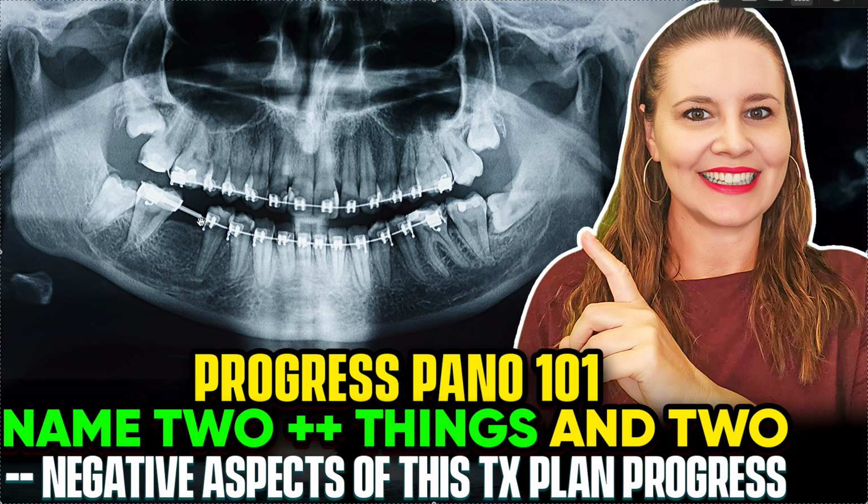I do like that they put in a piece of tubing or closed coil spring here. That shows me that they know what they're doing. Other thing I noticed that I like, that just shows me this was a competent doctor, these are just little things I look for in panos, is the fact that they cinched the wires in the back. That's the sign of a good doctor who's cinching wires. That means they're thinking ahead, they're thinking next steps. They have a long span. They can see that's necessary. Probably not necessary to cinch the top if you're in a heavy wire, but the lower definitely necessary.